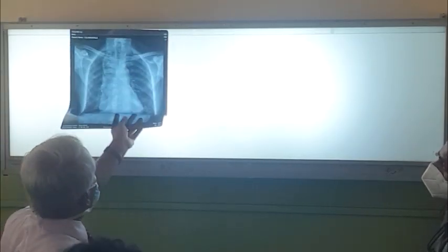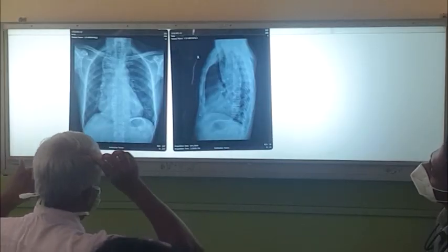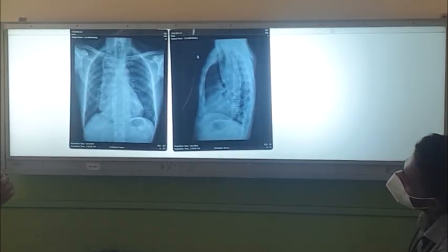Right. This one, just remember, right? This patient came with this stage. If you see this patient, this kind of X-ray, right? What is the diagnosis? The patient came with this area.